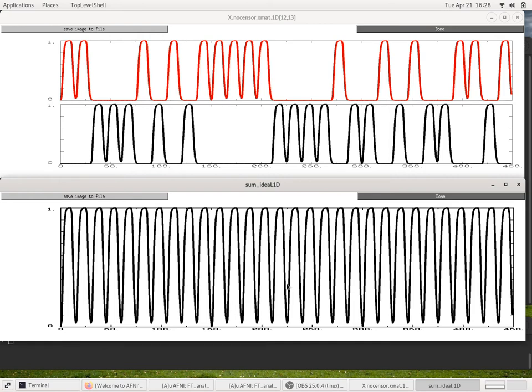And so you will easily be able to tease these apart. So the correlation is pretty high, or at least the magnitude is high. It's fairly negative, greater than 0.6 in magnitude, but there's still a lot of variance left across the regressors of interest. Well, it shouldn't be just those; it should be across all regressors, really. But you won't have any trouble separating which is an audio response and which is a visual response. So, no, the 0.6 is not concerning.